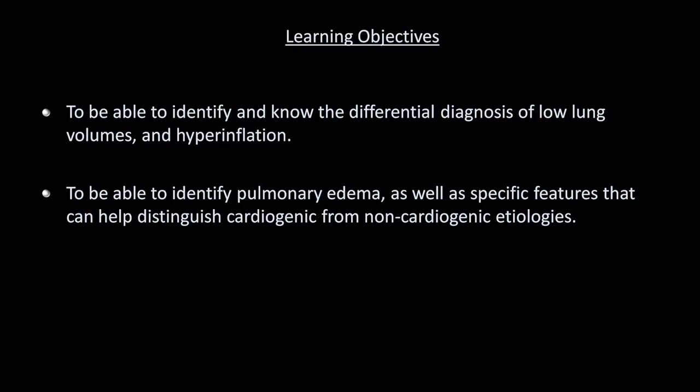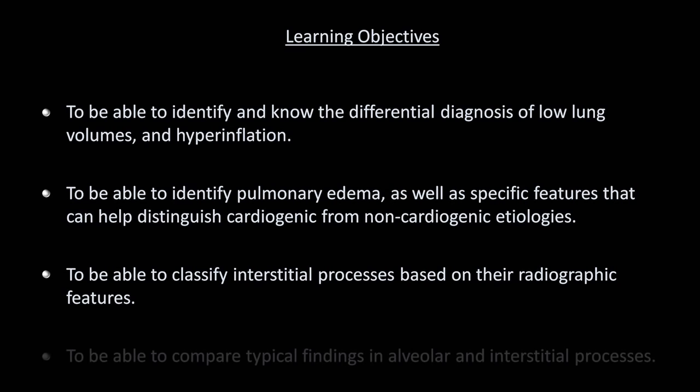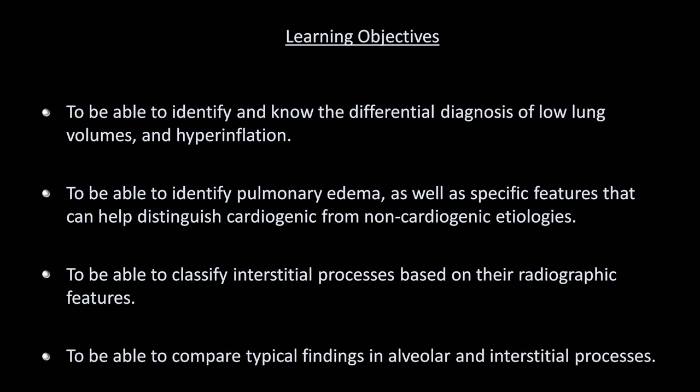Second, to be able to identify pulmonary edema as well as specific features that can help distinguish cardiogenic from non-cardiogenic etiologies. Third, to be able to classify interstitial processes based on their radiographic features. And finally, to be able to compare typical findings in alveolar and interstitial processes. The first topic in this video will be a very brief discussion of lung volumes.